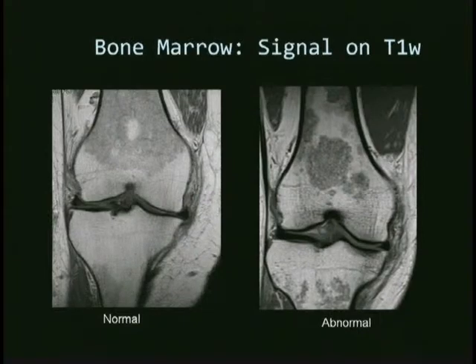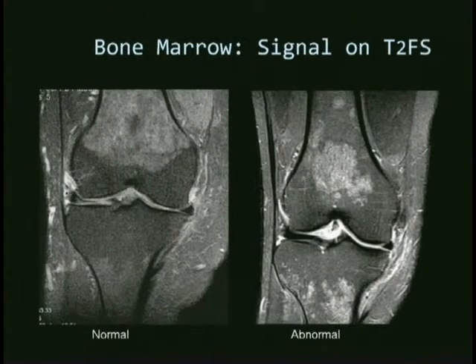Here I put the same patient on your left. It's a coronal T1, and you see that the patient on the right has lymphoma, and the marrow has a more nodular pattern. In the background, you see some foci of normal red marrow, but this has a lower signal intensity. If you compare it to muscle, it's not quite dark, but if you're not convinced, the T2 sequence was convincing, because in an adult, the red marrow should not be so much brighter than the adjacent muscle. So this patient had lymphoma.